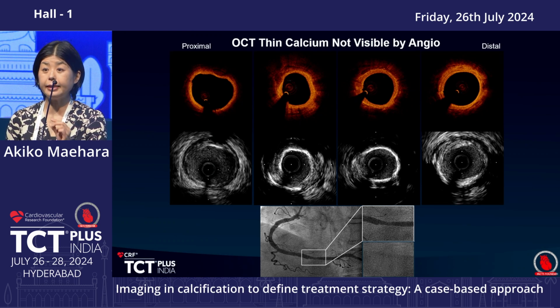We look into the OCT in the same case. You see the calcium is big, but those calcium is quite thin. Because of the thin calcium, total amount of the calcium is not so much. We couldn't see it by angio.